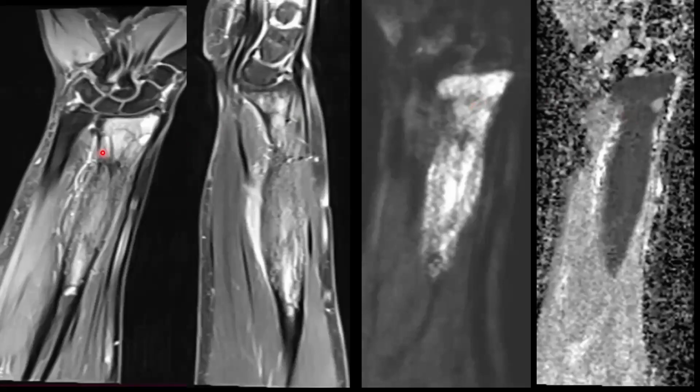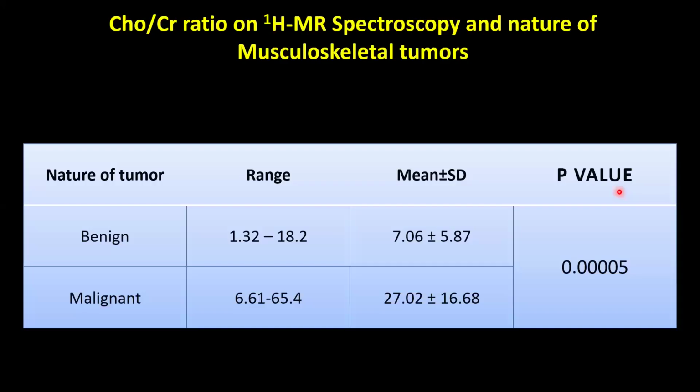This patient underwent post-contrast MRI, showing heterogeneous enhancement, and diffusion shows strong restriction with low ADC value. So it helps that we are dealing with some malignant condition. This patient underwent ultrasound-guided biopsy. It turned out to be a plasmacytoma. So it is a very rare presentation of the plasmacytoma, because as radiologists we know that plasmacytoma is usually osteolytic lesions.